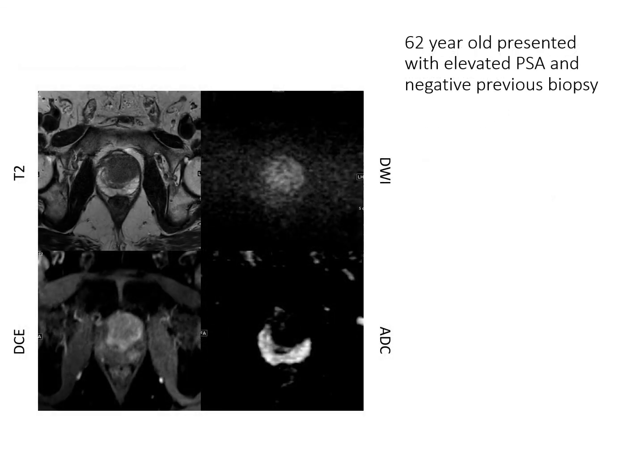This is a nice example. So this is when the patient had a biopsy already. So they had elevated PSA. They'd had the random TRUS biopsy, okay, and that was negative. And this shows a problem with TRUS because you're coming from the rectum and you'll sample the posterior gland better, okay. So they had all that. That was all negative. So then we did the MRI.